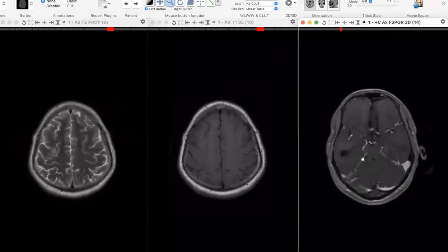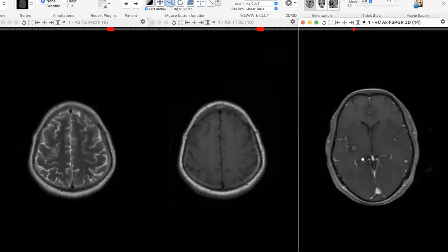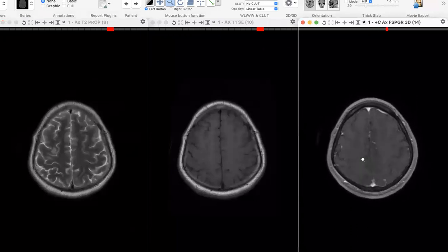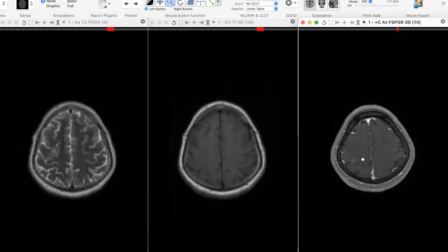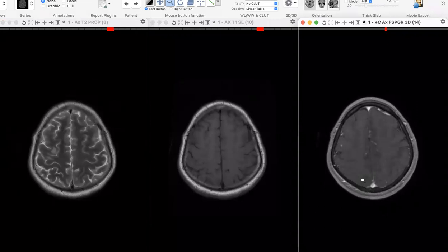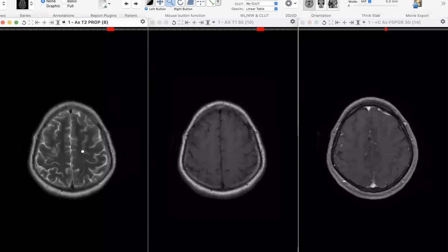Yeah. So there are multiple ring-enhancing lesions. You're right. This is neurocysticercosis, and this is quite characteristic of neurocysticercosis. Are you aware of the different stages of neurocysticercosis? There are 3 stages. I used to remember. Okay. Right. So no problem. There are 4 stages. They calcify in the end stage. So there are 4 stages.